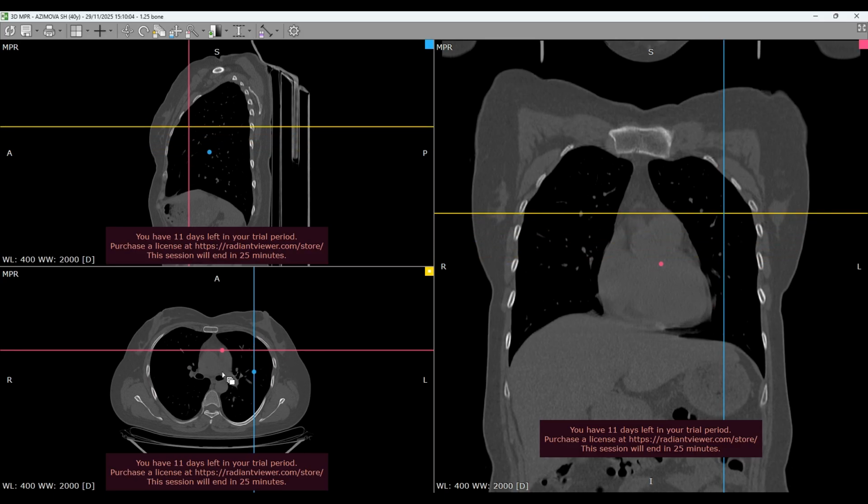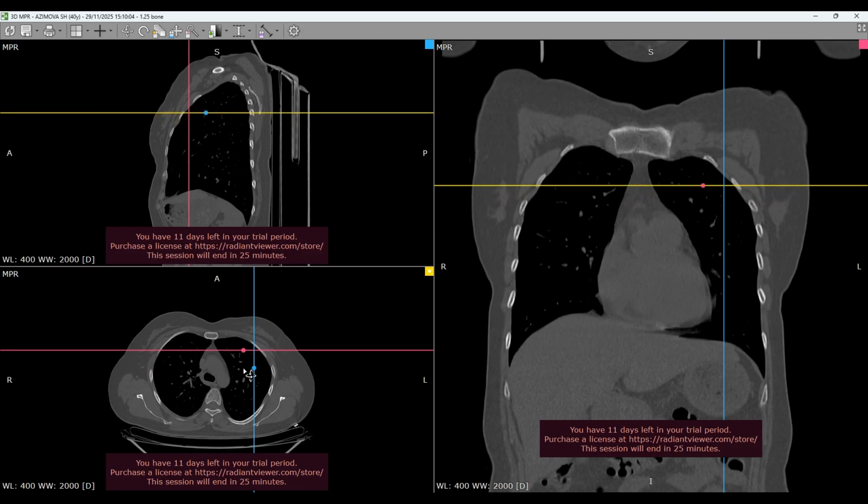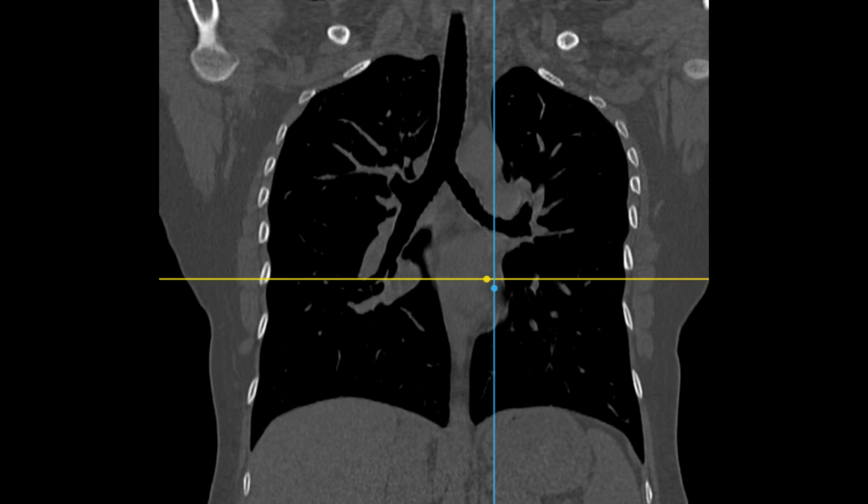Surrounding the lungs, the bony structures of the thoracic cage, mainly the ribs and segments of the spine, are seen as brighter, denser areas. These bony contours help maintain the shape of the chest cavity and protect the internal organs. The vertebral column, located along the midline posteriorly, appears as a sequence of repeating oval structures, each representing a vertebral body. The ribs are visualized curving outward from the spine, forming the protective ribcage. These structures appear dense and white, consistent with normal bone tissue on CT.